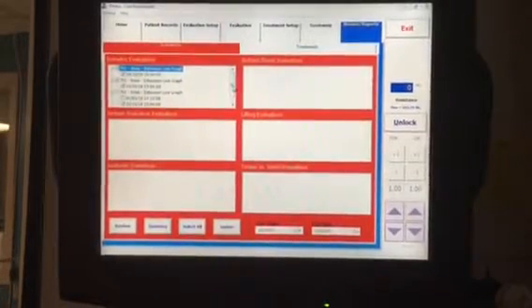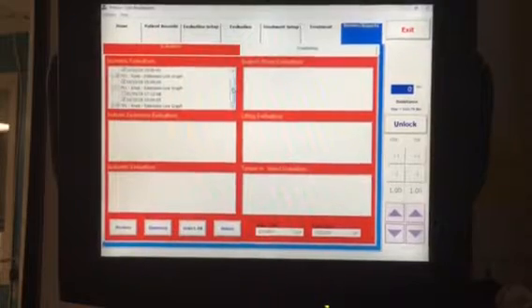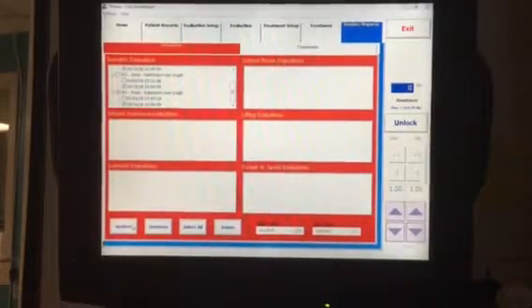We're going to select the 10-10 tests, meaning October 10th. You can click the little plus and minus sign there to select the appropriate days. Once you have the selected test, you're going to click on review, which is just down here.